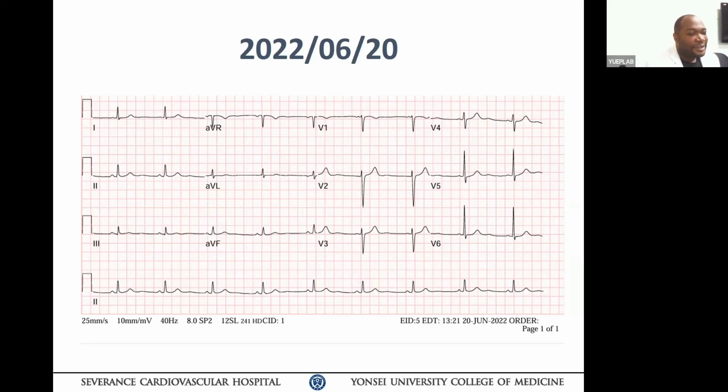So do we have to discuss more? So here now, the PR is a little bit shorter than normal, right? If you say the heart rate is 70 or so, or even maybe 50, sometimes more evident, it is a little bit shorter than you like to see. In other words, the PR segment should be proportional to the rate.